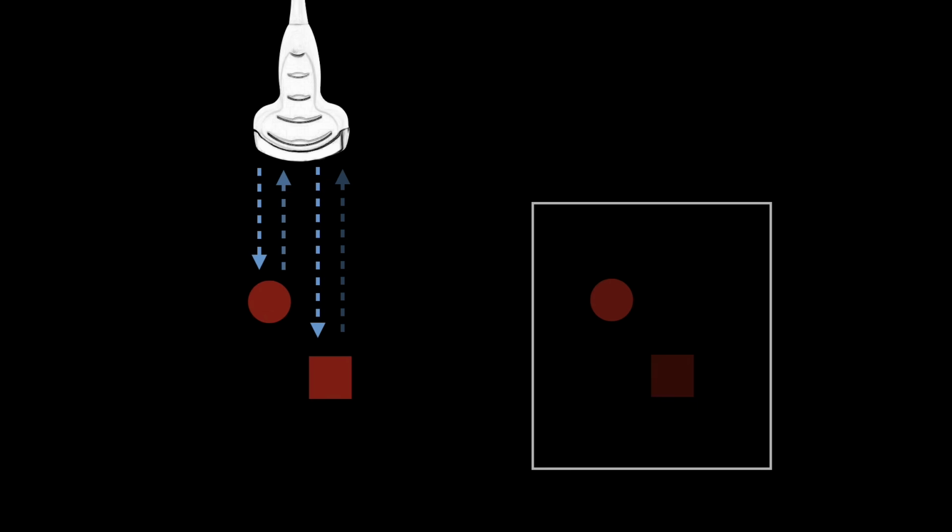When we break this, obviously we get some artifacts, right? If we have a signal that bounces around, you can get a mirror image artifact. And that's why around the diaphragm, you can see some liver structures kind of up in the chest and things like that.